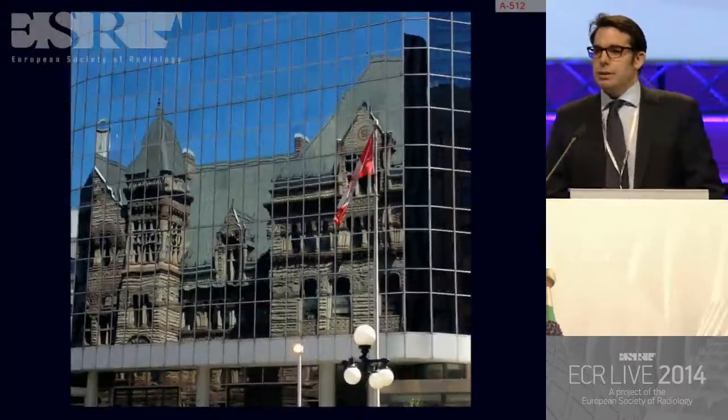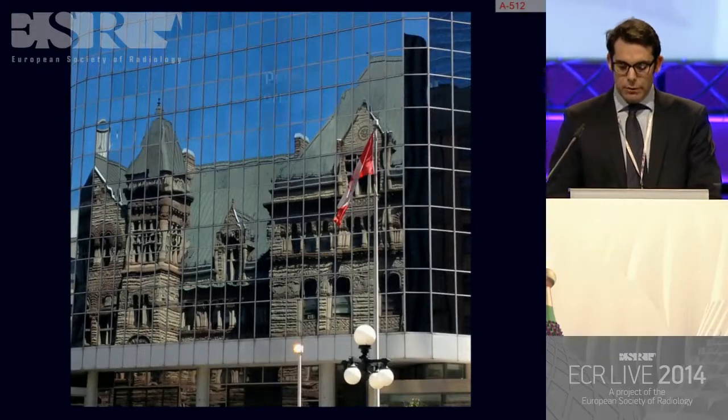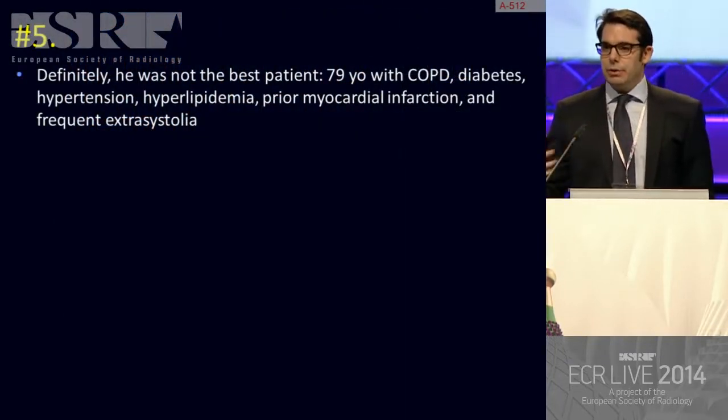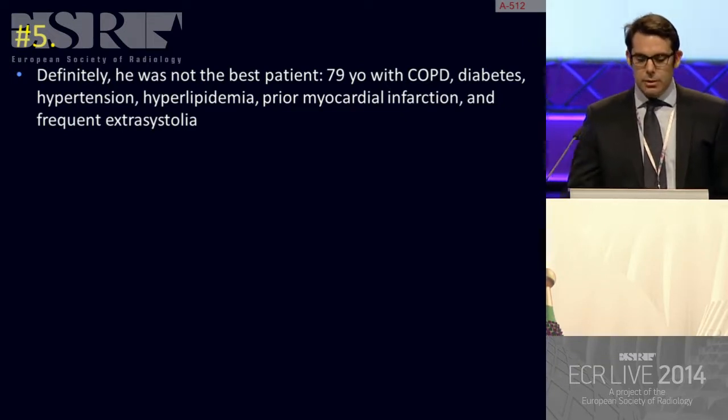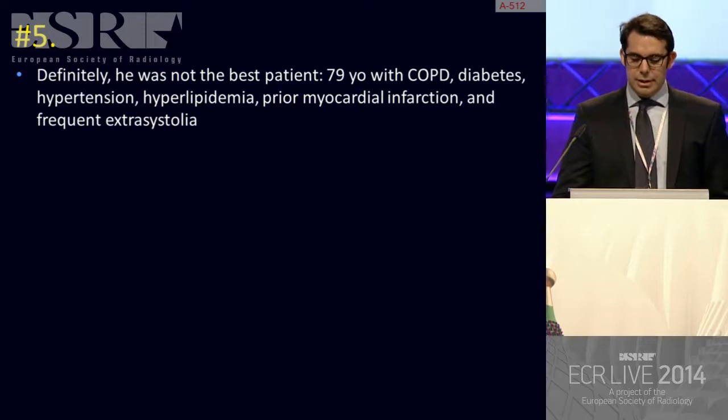Let's move to another one. Let's move to what looks like something, but it is not. Let's look for artifacts now. Let's see how we can deal with common artifacts in regular practice. So this is the first case I'm showing to you. This was definitely not the best case that you could do.